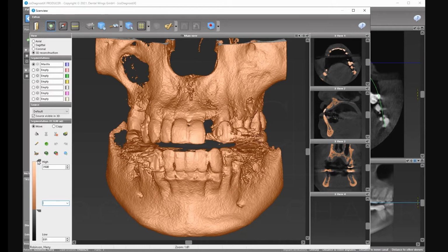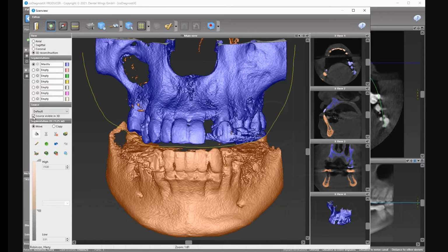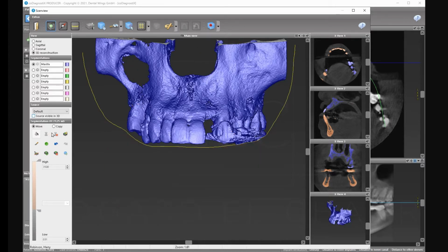All right, so now we have this done. Now I go to the scissor. And what I mean by the scissor, I go like this. I remove the upper from the bottom. And I paint it. So I press on paint. Now it excludes it. Now what I do is I go back and I eliminate the source. So it removes the part that I don't want.